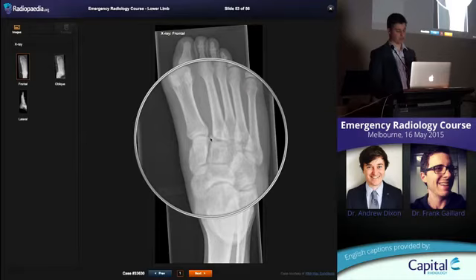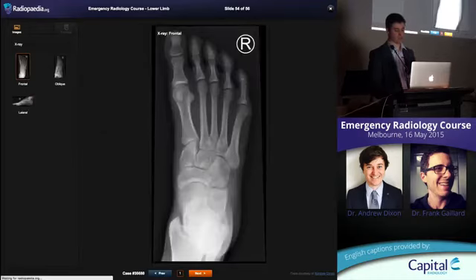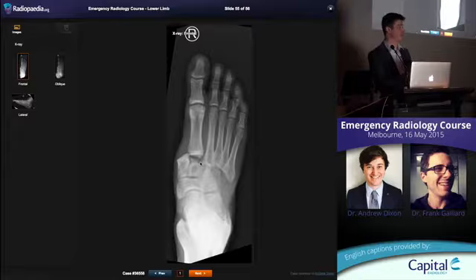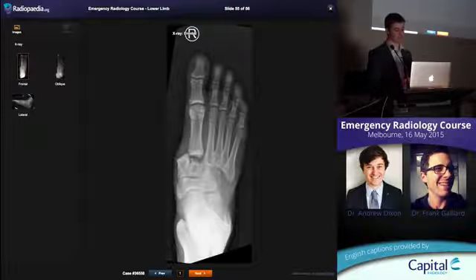If you look at that's the normal orientation. Here's what happens when that joint dislocates. And that patient who's got the fracture there, the avulsion fracture of the ligament, they're at risk of this happening. It's going to be unstable. All those metatarsal bases are going to start sliding off to the side unless there's a surgical repair. Even if it doesn't slide all the way off, you're going to get altered mechanics, you're going to get degenerative disease of that midfoot. Okay, so Lisfranc fracture dislocation.